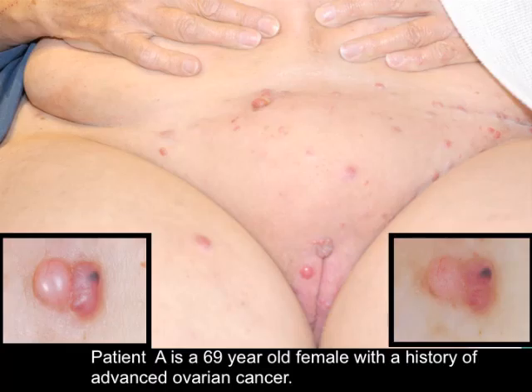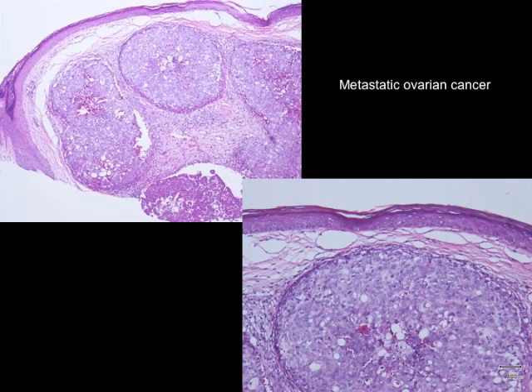Patient A is a 69-year-old female with a history of advanced ovarian cancer. She has multiple cutaneous metastatic foci, each revealing a clinical and dermoscopic morphology similar to the one presented. The lesion in question was biopsied and was indeed a metastatic focus of ovarian cancer.